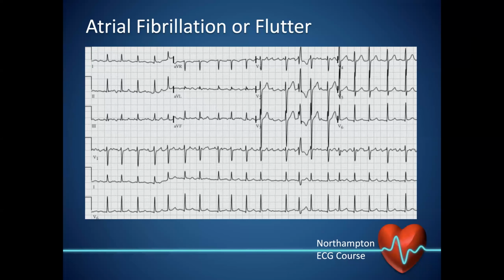So it's interesting, if you looked at that last clip, I don't know about you, Julius, but just looking at it from a quick glance, I would say, oh, PACs, right? Because it almost looks like there's some degree of regularity in the rhythm strip. But then when you really look into it, if you pull out the calipers, he's right, there seems to be some irregularity to it. Yeah, that's right. Absolutely.